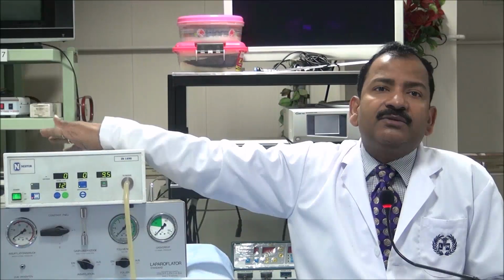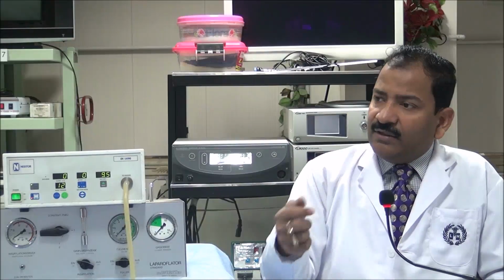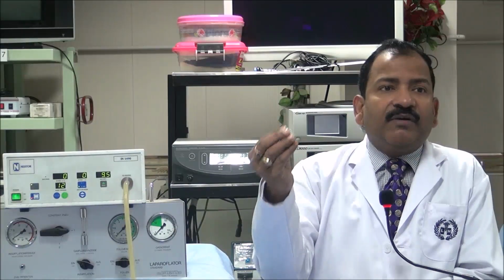So this industrial CO2 is bad. Leaking is bad for us also. For the patient it is not very bad because the patient is exposed only one time. And we are exposed every day. So that has a carcinogenic effect. Once the interior milieu is maintained, the inside environment is cut off from outside. So at the end of the surgery, when you are pulling out the cannula and emptying the abdominal cavity, a lot of that CO2 comes out with burned tissue, viral DNA, bacteria and carcinogenic substances, and if you are inhaling it, it is bad for you. So that's why it should be avoided.